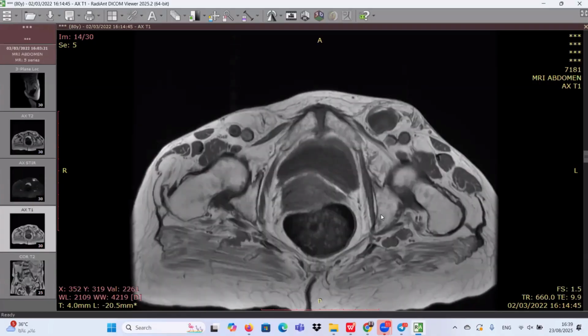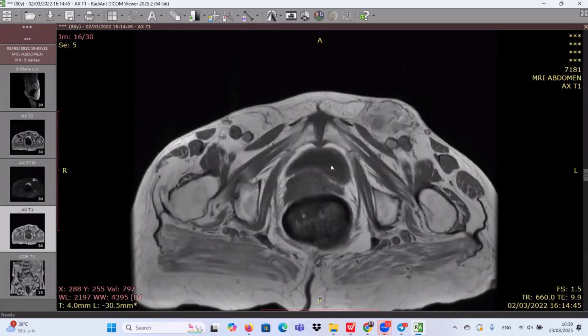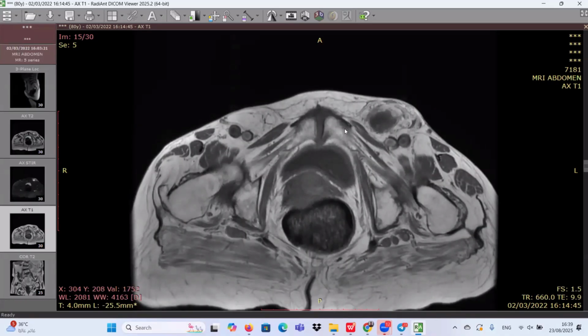The horizontal line you drew a while ago, what exactly does it intersect? It's exactly the pubic tubercle. In the CT it's easier to identify that pubic tubercle at this location. The line there is two lines, one perpendicular to the pubic tubercle and one parallel to both pubic tubercles. Okay, thank you, doctor.